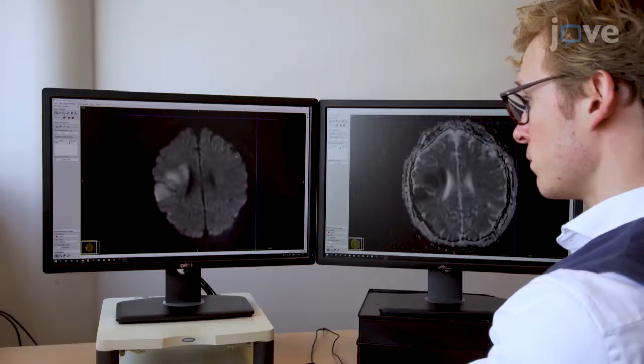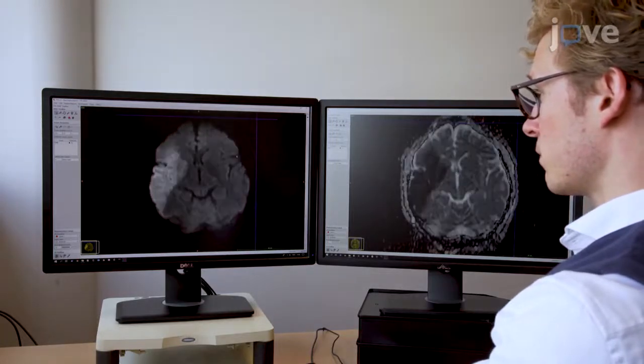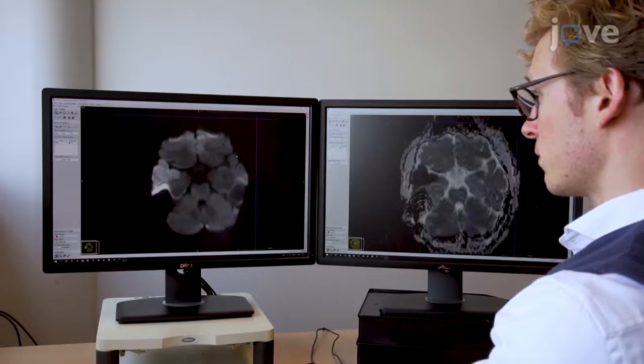The lesions must be transformed to standard space to allow for comparisons across subjects. Each patient's brain must be spatially aligned to correct for differences in brain size and shape. While using this method, it helps to see how each step should be performed, rather than following written instructions alone. It also requires a good understanding of brain images, which makes a visual demonstration useful.